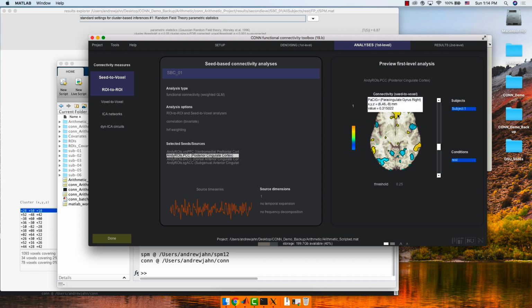Okay, so I'm just demonstrating that this thing actually does work. I only used a single voxel. You can use more. You can place them wherever you want, but it reads it in pretty well, and then you just simply do the rest of your steps as you would.